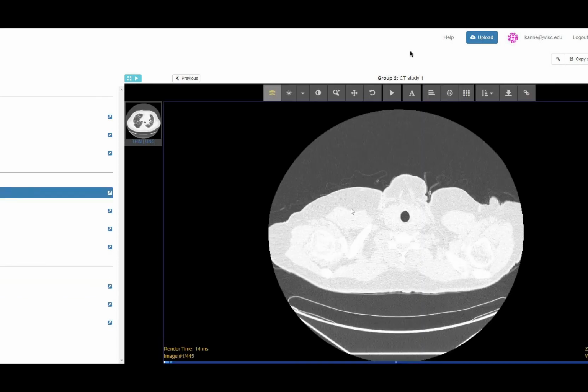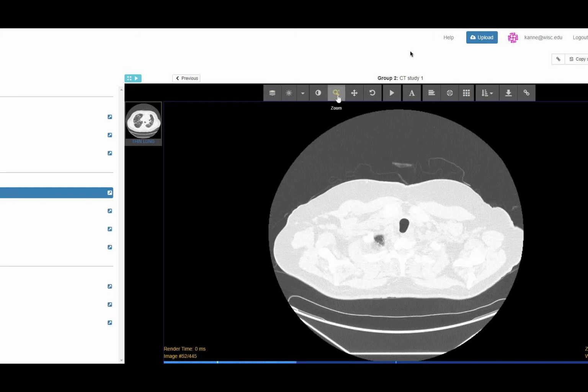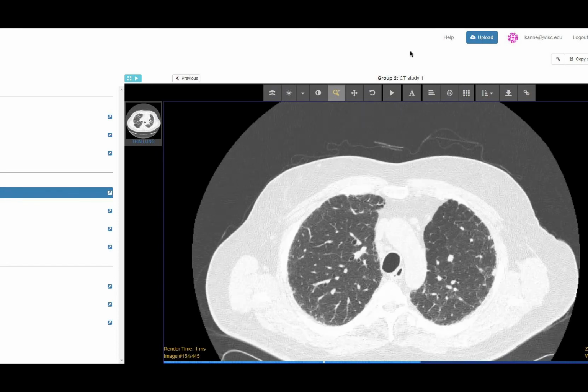All right, and this last case is also kind of interesting. This is another ILD case where time is very important, and I guess it's possible there's two things going on, but I seriously doubt it. Let me make it a little bigger. So this was the scan as presented. So this is the most recent scan.